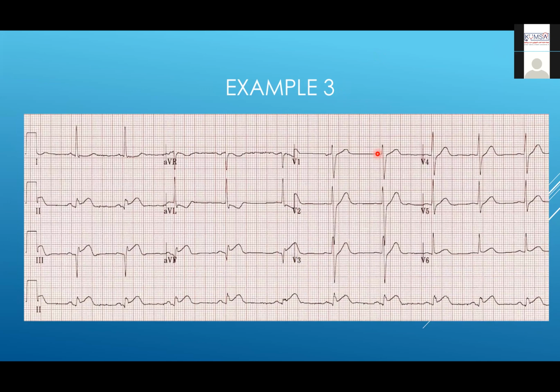Okay. Yes. Can I interpret it? Yes. So there's ST elevation in leads 2, 3, AVF. So this is an inferior MI, and reciprocal changes in AVL, I think. Yeah. Perfect. Excellent. Sorry, I didn't catch your name. Who was talking? Dalal. Thank you, Dalal. So yeah, like Dalal said, ST elevation in leads 2, 3 and AVF and reciprocal changes in AVL.